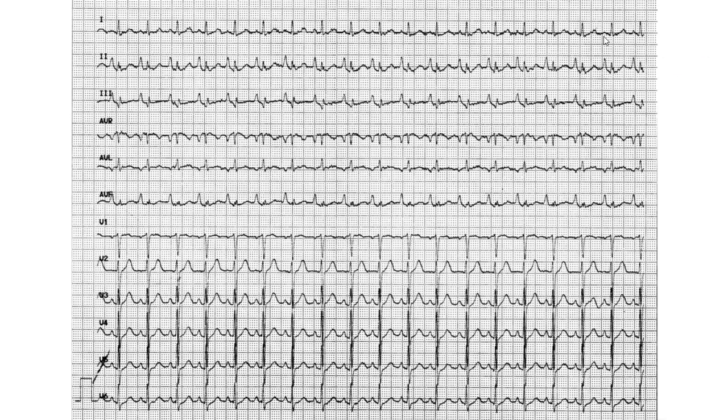We can clearly see 1, 2, 3, 4, 5, 6, 7, 8, 9, 10, 11, 12, 13, 14, 15, 16, 17, 18, 19. This guy had a lot of coffee. This guy is 19 times 6, 114. The guy has had a lot of coffee. This is tachycardia, clearly, okay? And you mark that as a pathology.